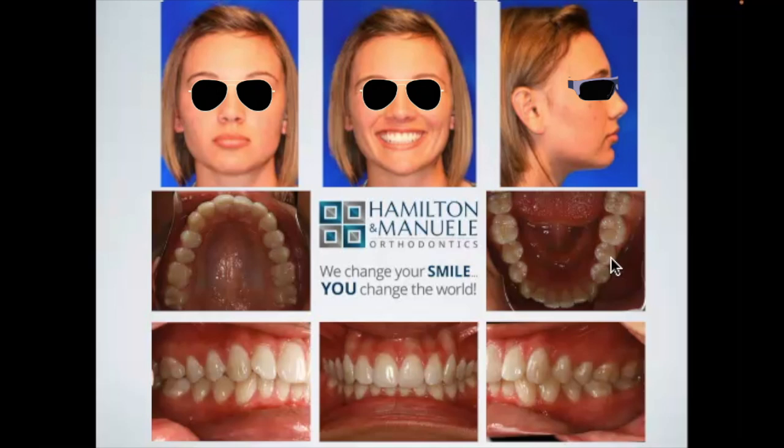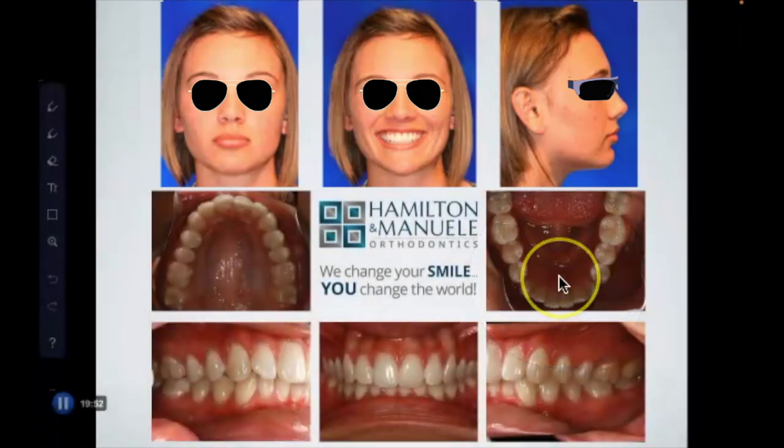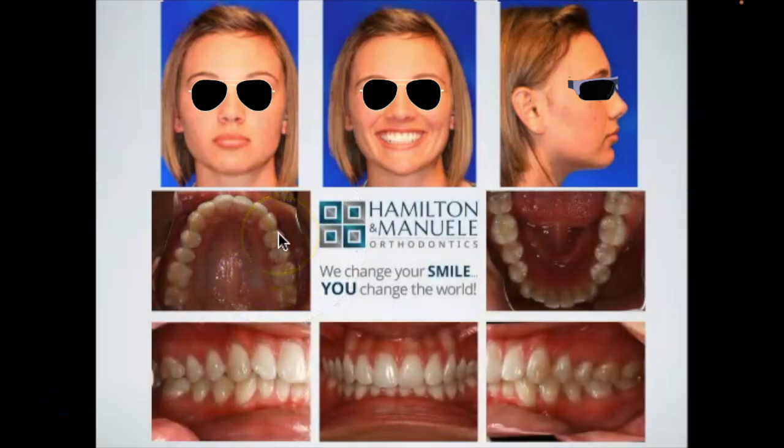And this is where she came in later with all the permanent teeth in. So, how did Mother Nature do? Pretty good, right? The incisors don't look terribly proclined. There's a little bit of crowding. We talked about having probably a little bit of crowding in this area. You can see it now, maybe 3 or 4 millimeters of crowding there. A couple millimeters on the top, which is about what we thought. Again, we held the space on the top there.